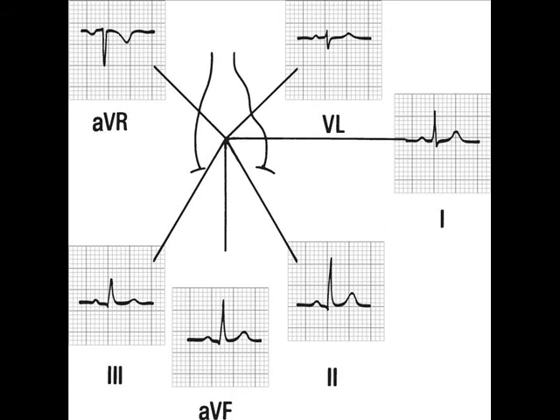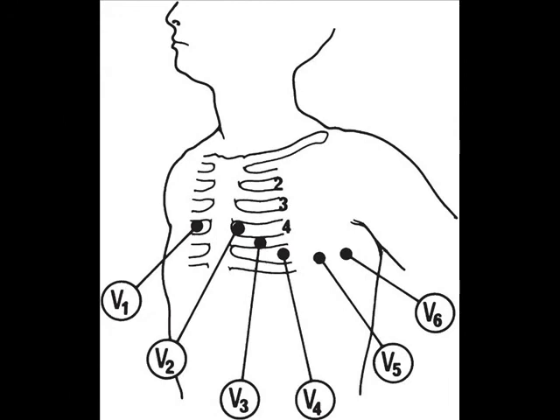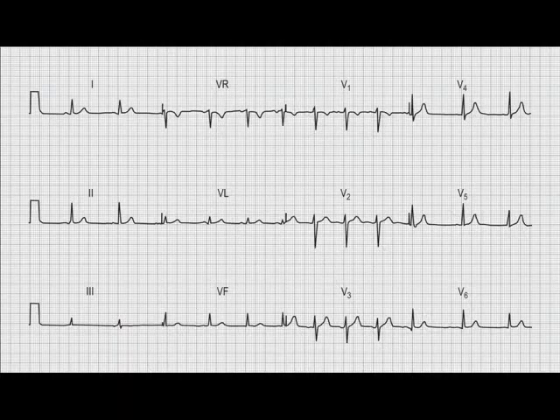I'm not going to cover that in this workshop, but I've introduced the terms to you, so you might like to look those up. And then look at the chest leads. We're looking at V1 or C1 through to V6 or C6, and they should progress, as we've explained, from negative through to positive. Once you've done that, you can start picking out the abnormalities amongst the tracing.